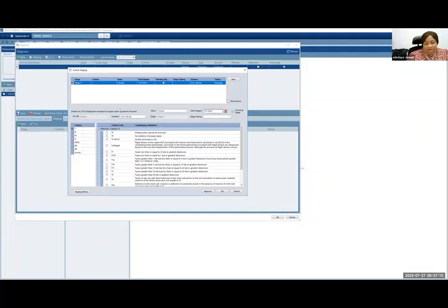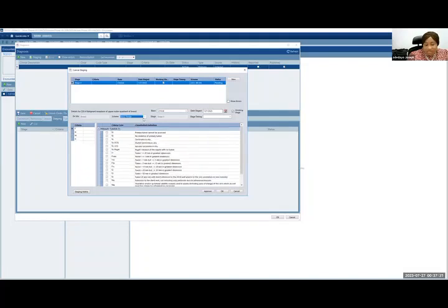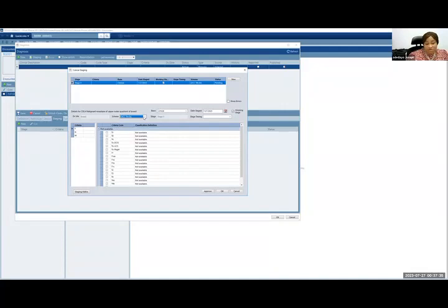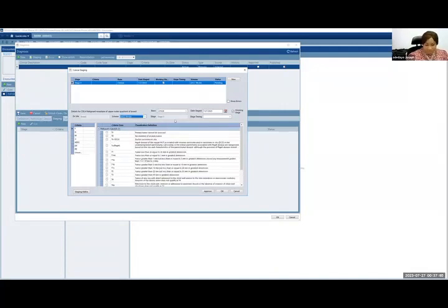So again, on the second line, disease site is breast. The staging scheme you are using, AJCC 8th edition, is the most current edition. But if you wanted to use a different one, you could select that here. If you wanted to use 7th edition, you could select it. If you wanted to use 5th, you could select it. But 8th edition incorporates all of the HER2 positive status and so on. If, for example, you didn't have all the information you needed, you might want to use 7th edition staging, or you might want to use custom, but we'll talk about it in a little bit.